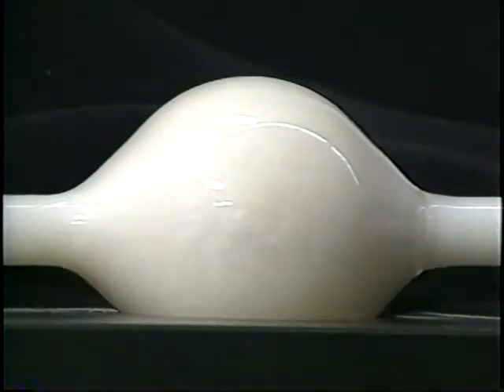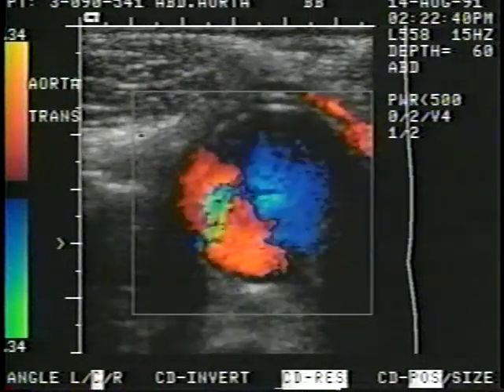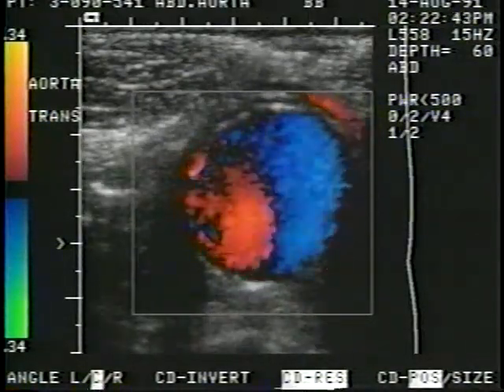Module 4 demonstrates an aneurysm. The optimal flow rate is medium to fast. Flow patterns in an aneurysm are dependent upon aneurysm size and the amount of thrombus contained within. In this module, there is an open aneurysm, free of debris, and violent disruption of the streamline is observed. A high-velocity jet into the central axis slows and gives rise to eddy currents with a reversed component. The color Doppler segment illustrates the blue-red of disrupted flow in this aneurysm.